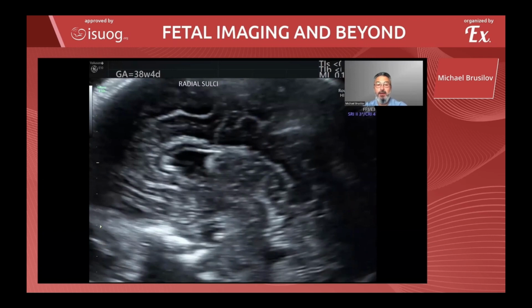You can see here radial sulci coming until the level of the corpus callosum.